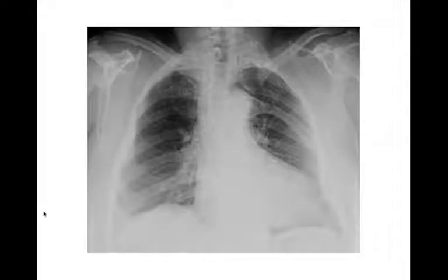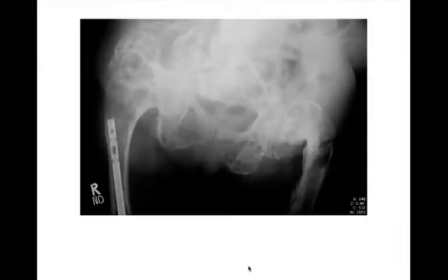So, a chest x-ray. I'm not showing you this for the lungs, so look at the bones, see if you see any findings. Symmetry is your friend, so look from side to side, and as we're going down, certainly this rib on the left looks abnormal. It doesn't look like the other ribs. So we have the expansile rib lesion. It's a very long lesion going out and expanding the rib. And this is their pelvis, and once you see the pelvis, the answer is clear.